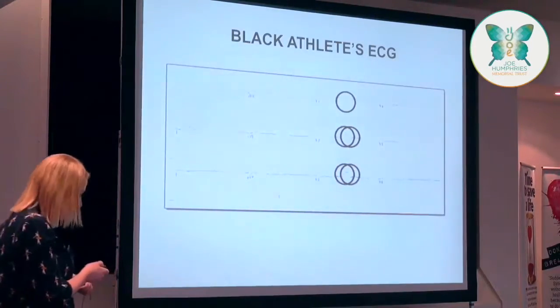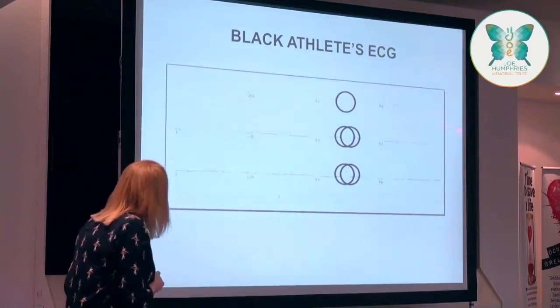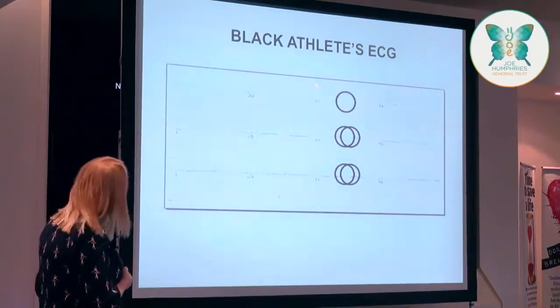Oh, and this one, I don't know how well you can see. Can you see that one very well?